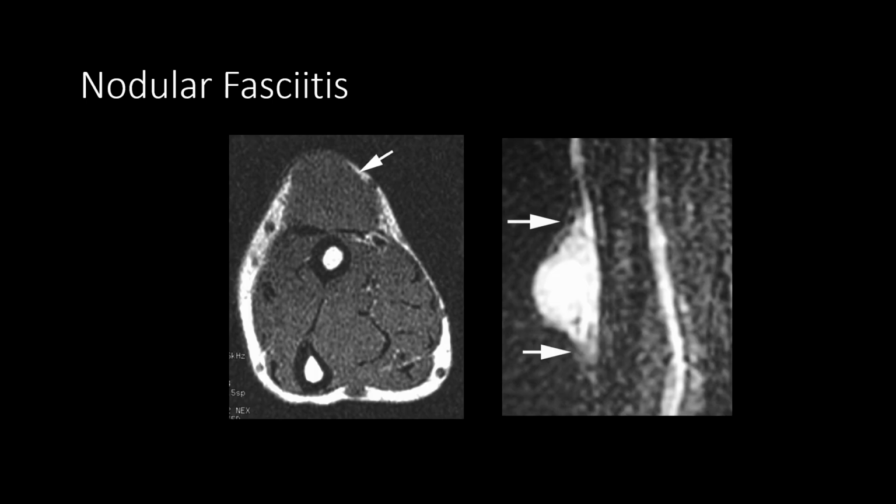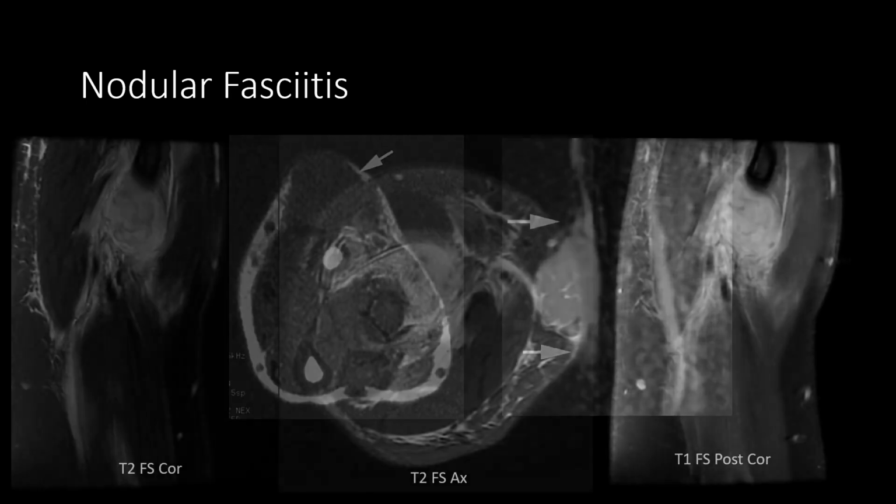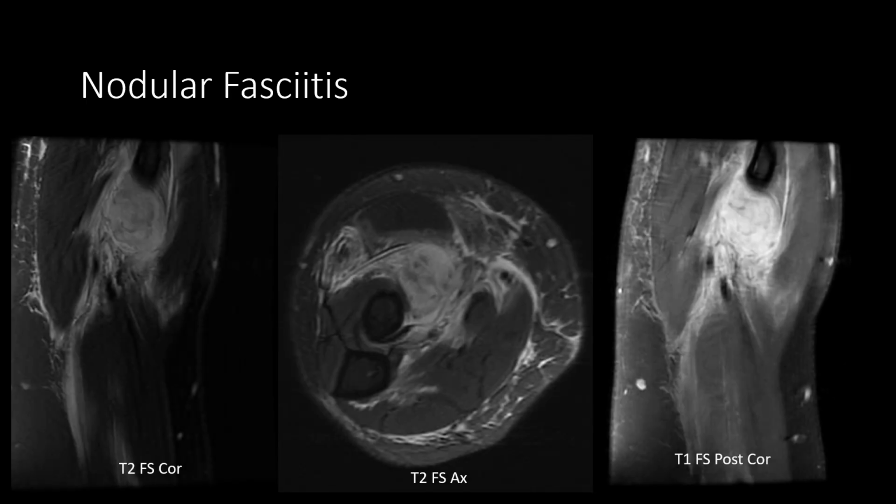This one from the literature, that's pretty big and gross. That makes me a little bit uncomfortable. I think I'd probably go for biopsy there. And this one from our institution was just really difficult.